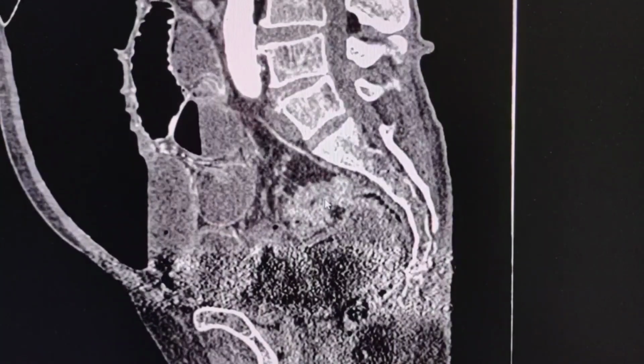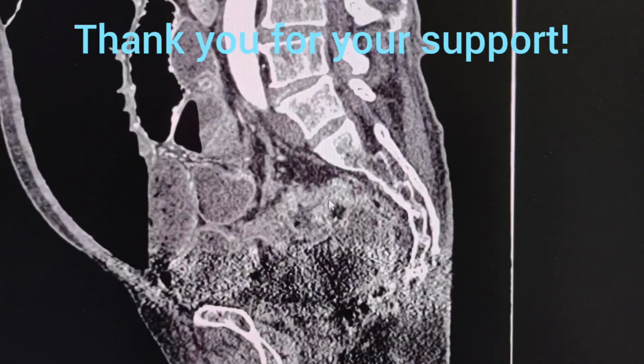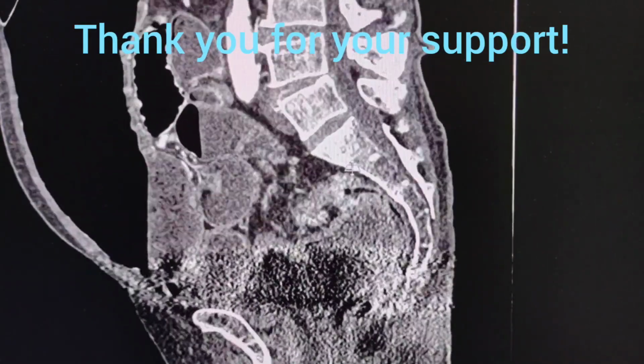Let's go back to the major finding here. This is the colonic tumor once again.